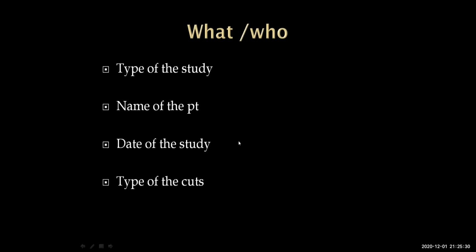Then you have to make sure all the cuts are there. And I'm going to show you in a minute what are the essential cuts that we need for diagnosing a knee problem. So the type of the study, the name of the patient, the date of the study, and all the cuts in the envelope, including the report, are of paramount importance.